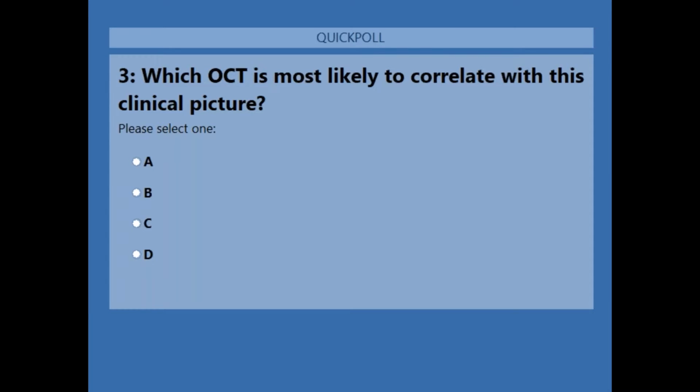We've got four different retinal pictures there. And again, we think this is dry macular degeneration. And we're going to cover what dry macular degeneration looks like in an OCT, which I'm sure most of you know already. So we'll review that before we go into OCT angiography, but really trying to pick up subretinal fluid, intraretinal fluid. But here's the point I want you to remember as we transition from OCT in the discussion to OCT angiography. When we're using OCT, we're often waiting for fluid to leak into the retina. We're waiting for that choroidal neovascular membrane to leak the fluid.